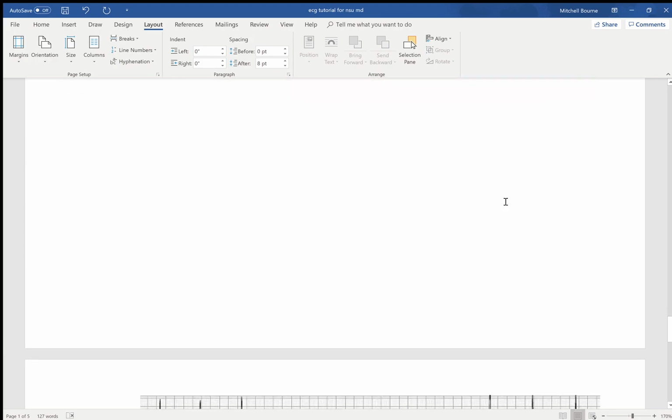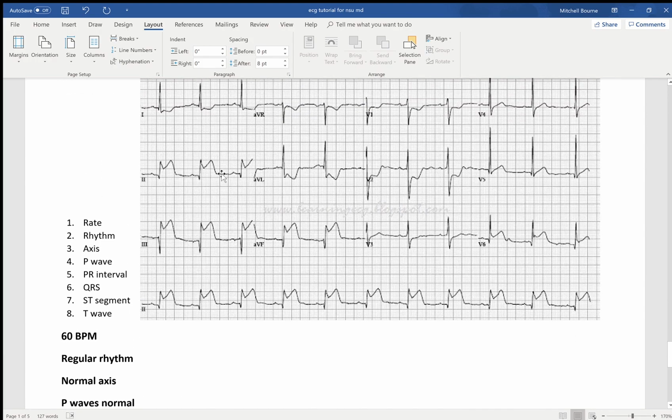So when you look on the EKG, 2, 3, AVF are the inferior portions. 1 and AVL are electrically opposite. If you look at AVL especially, it's essentially a mirror image of 2. Okay? Essentially a mirror image of 3. If you took this EKG on a piece of paper, you put it upside down and looked at it through light, you would see ST elevations, right? This is essentially mimicking 3.